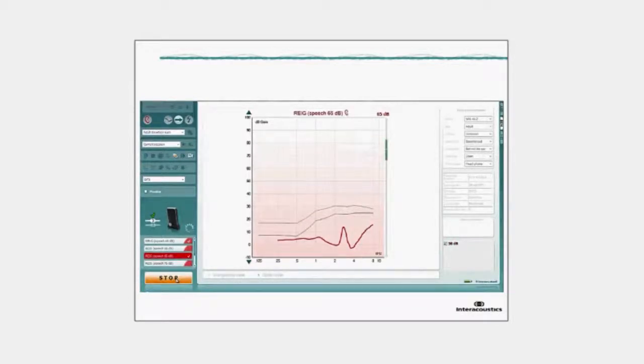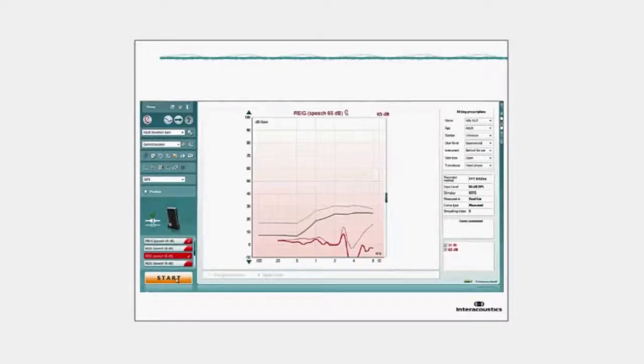On running the next measurement of a louder target intensity, you'll notice that it's also going to pair. For this example, this was run without a hearing aid connected, hence the measurement being away from the target. And now, because the two measurements are paired, it brings them into focus, so they're darker, and on enabling and disabling, it will remove both the target and the measurement from the test screen.